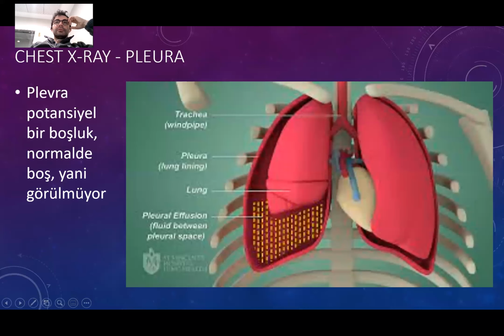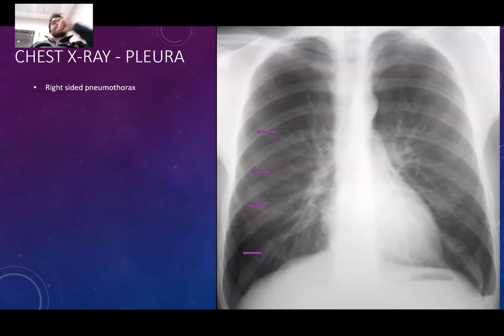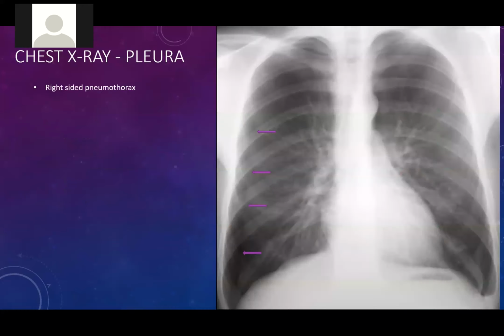Like this is abnormal, right? This is abnormal. So pleura is, sorry, doctor. Yes. Can you go back to the pneumothorax? That doesn't look like emphysema. Emphysema is supposed to be inside the lung, right? Then why am I seeing the right border of the lung here? Okay, so there is something obviously outside the lung, right? Okay, thank you.